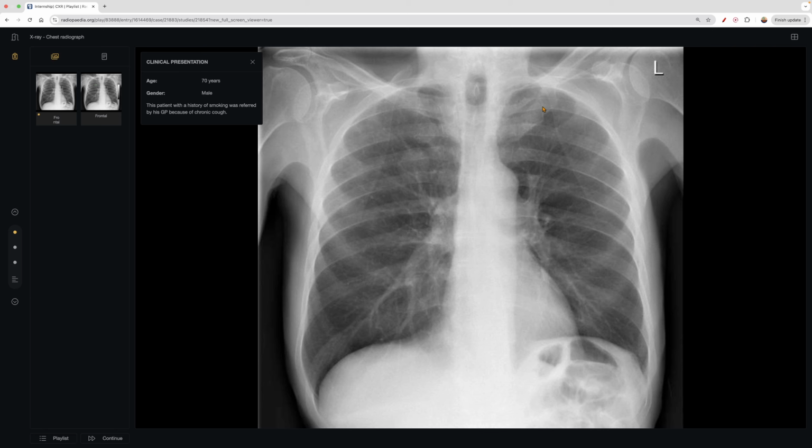So the left lung looks pretty fine. Pulmonary vasculature looks a little funky, but maybe they're normal. Otherwise, nothing else to remark. Coming up, coming down, coming up. Whoa, what's that? So there's something here, and it's round. It doesn't look like a cavity, so it must be a nodule or mass. Visibly, it looks like it's probably going to be a mass, greater than 3 centimeters. Then we come down, pulmonary vasculature, and nothing else to comment on. So this looks like malignancy, right? Let's see what this one shows. And here's our measurement, our green line. It's a mass.